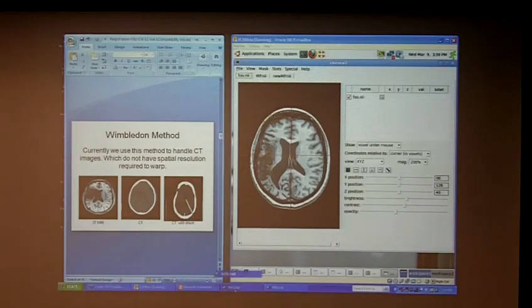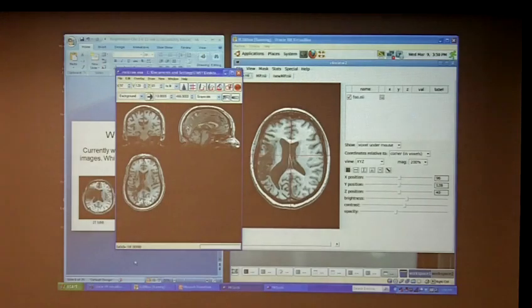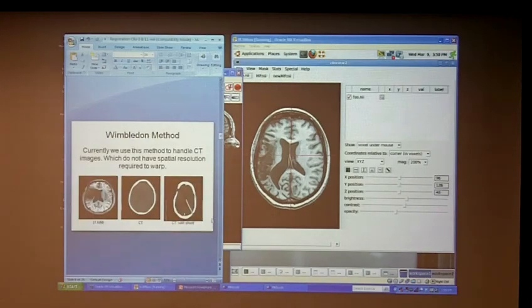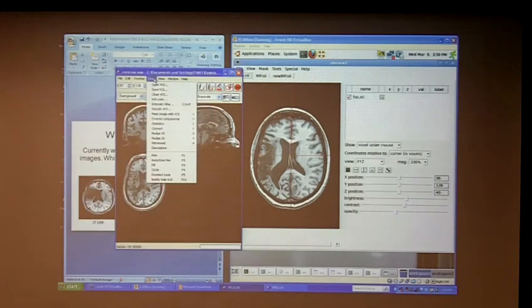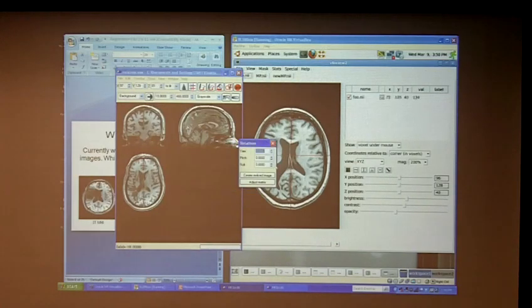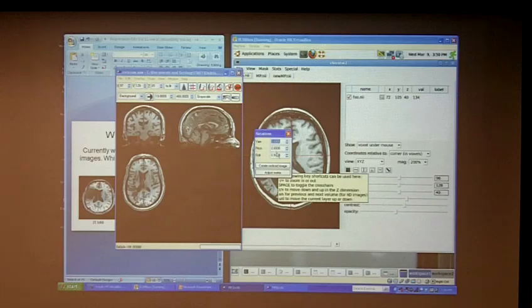And I think before I had mentioned the MRIcron that it doesn't actually have pitch. That's actually not correct. If you actually go under the Draw menu, Advanced, and do Rotate, this actually then gives you the ability to change the pitch. For us, we've typically only done just changes in pitch, but you could do changes in the other planes like yaw and roll.